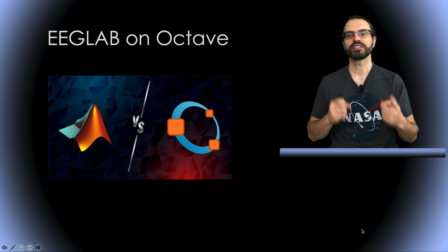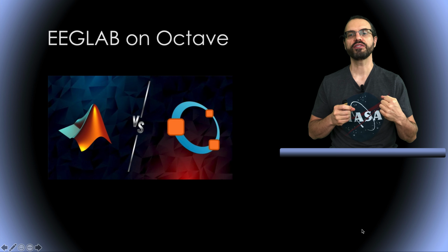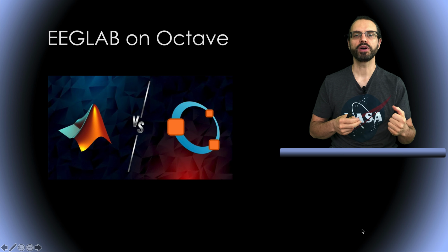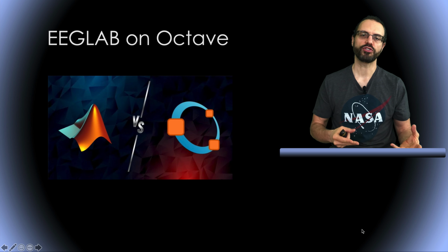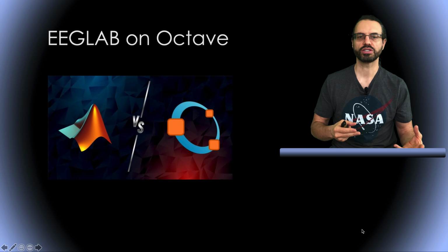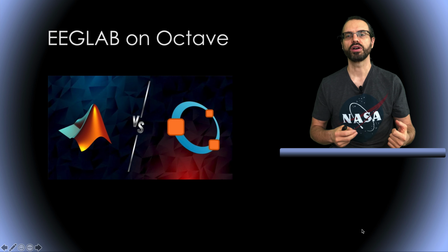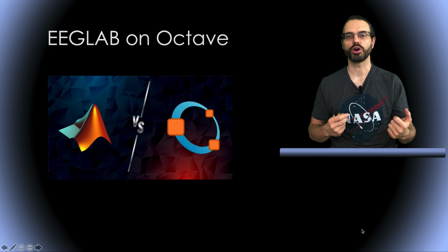The third and last option is to use Octave, which is free. We would recommend this option if you're already familiar with Octave and want to write advanced scripts but do not want to use Matlab. Also, this is a viable option if you have access to high-performance computing resources, such as a supercomputer, but do not have access to Matlab on these resources. We do not recommend this option for beginners, though.